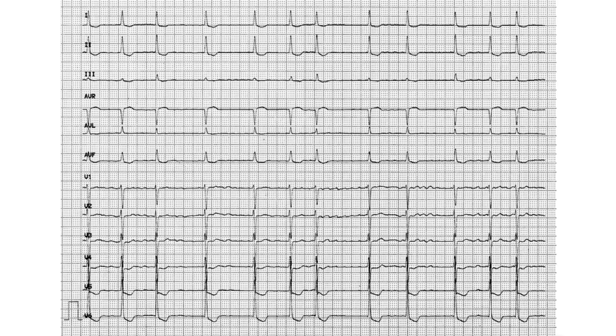Okay, example 22. Whenever you're ready. 3, 2, 1. Yes, you're ready now. If you're not, you can pause. So, irregular instantly. I'm not going to tire myself. As you see, the more you practice on this, the more quickly you go through these.